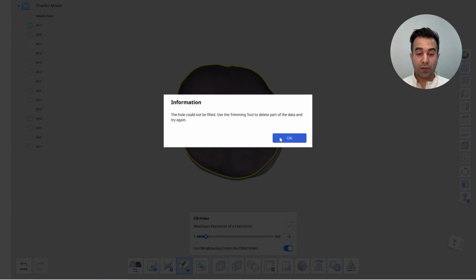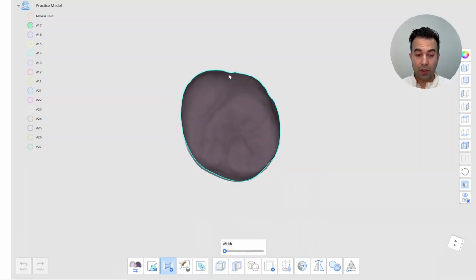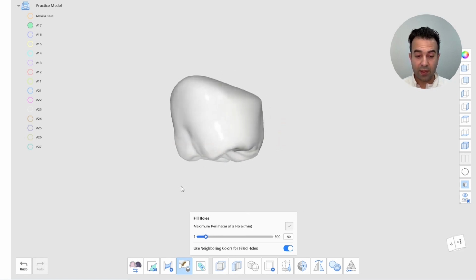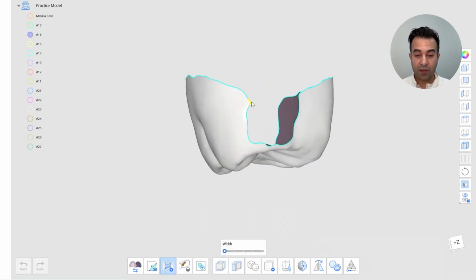But what you've noticed, you'll get an error message because it's a big hole in the center. So one trick around it, you can divide the hole into two smaller spaces by bridging the center. That's it. When 7 is complete, let's move to 1/6. Repeat the same process again.